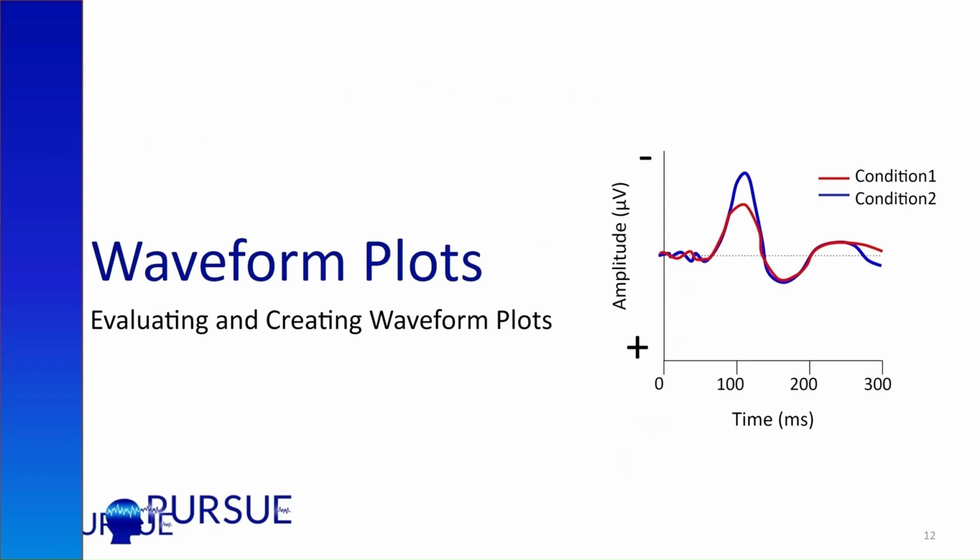That was an overview of the figures used in ERP research. Now I'll be going over the specifics for waveform plots.